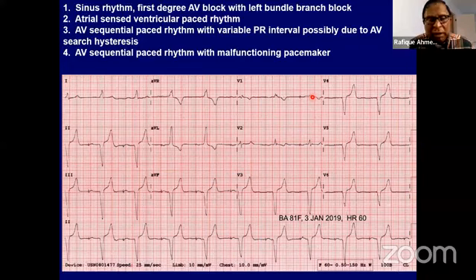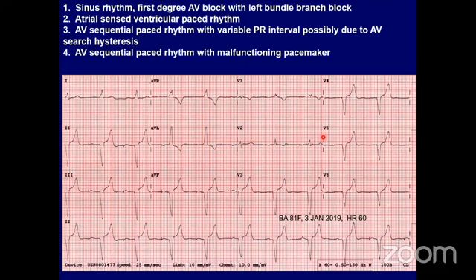It is because the QRS is relatively narrow. The other possibility is whether it's a biventricular pacemaker. I don't think this was a biventricular pacemaker. It was a regular pacemaker. The interrogation shows that it is a dual chamber pacemaker, but still V1 shows the RBBB morphology. Yes, you're right. Absolutely.